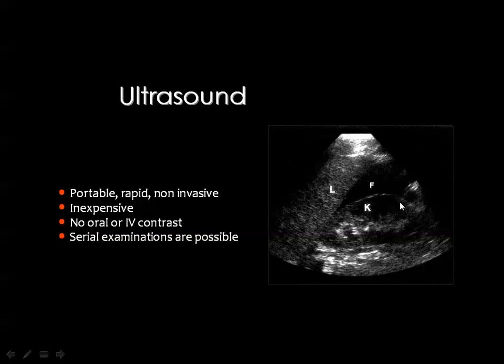The patients are usually unprepared for the ultrasound examination, and bowel gas may disturb the ultrasound images, and so the main target of emergency ultrasound used in the casualty rooms or departments is to detect intraperitoneal fluid.